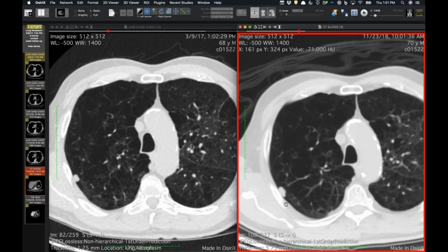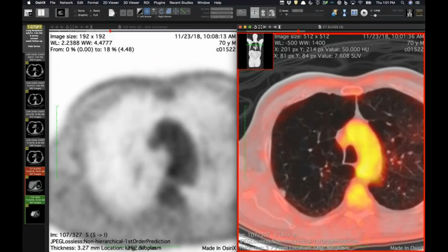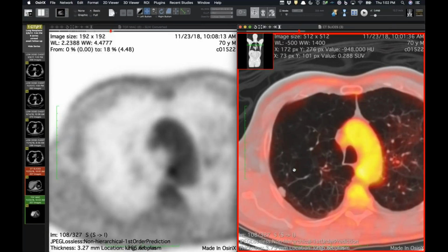Okay. Yeah, I think one should definitely give points to the PET being negative. I think that is informative in terms of what this might be, a less concerning lesion, even if it's growing a bit. Yeah, because there's absolutely nothing in that. So it's bizarre. If you took this thing even just as it is now, ignored the growth, and just looked at the PET and used the Herder predictive rule, and you plugged that in, even if you plugged in emphysema, the PET negativity will carry a lot of weight, and you'll probably get a really low number for the possibility of a lung cancer. But it is interesting that it is getting a bit bigger, but it's got smooth margins and is PET negative.